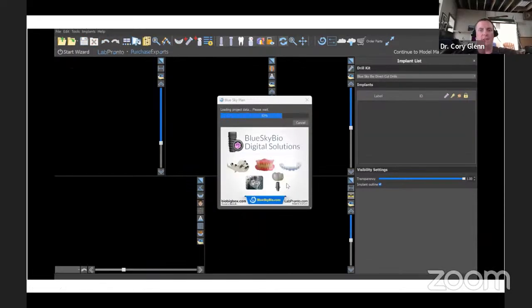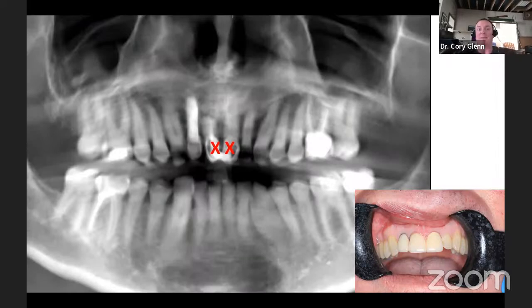And we'll try to get you answered. All right, so that's the segmentation. You saw 3.5 minutes to do the maxilla, the mandible, and all the mandibular teeth. She didn't have any maxillary teeth, so we didn't have to do anything.